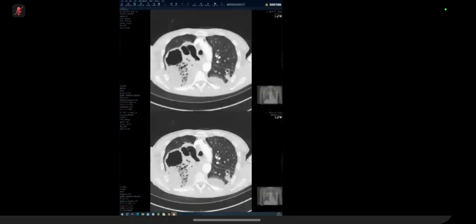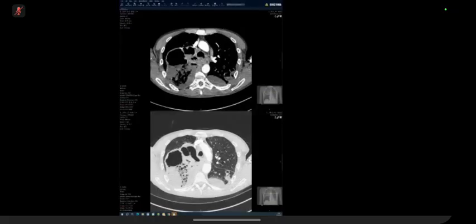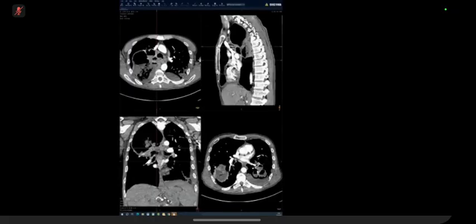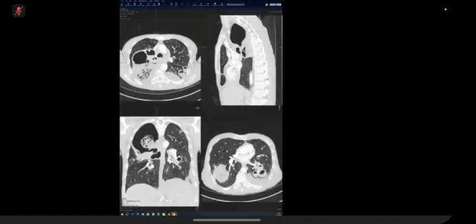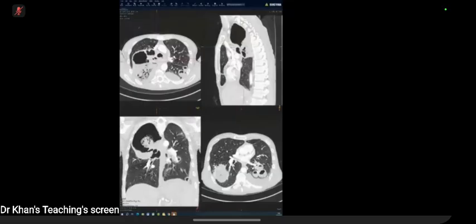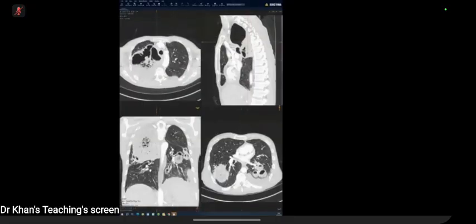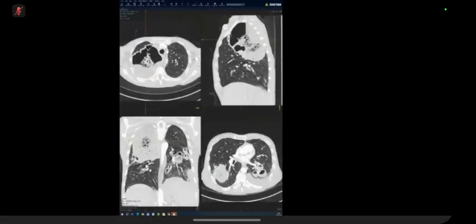In my opinion, the angle between the lung is acute. I just want to see the coronal to confirm. Okay. In my opinion, this keeps more with lung abscess. Okay. And this thing floating inside it, what is that? This may be pus component, or maybe rest of necrosis in the parenchyma.